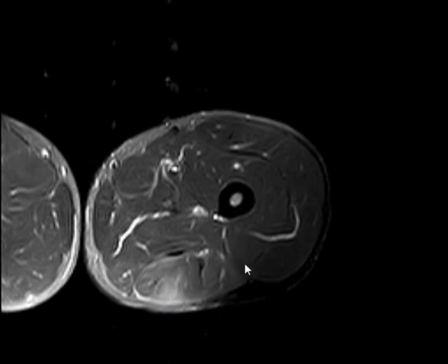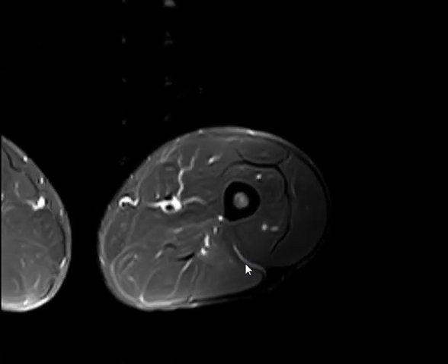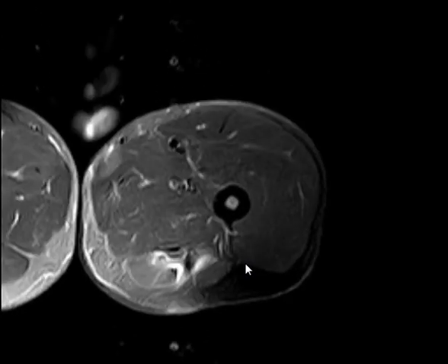So we are done: adductor longus, T2 hyperintensity. Look at the site, look at the anatomy of the muscle. Which site? Go up. So you can see this hypointense tendon of origin, right? This is the tendon, and this is the belly of the muscle. So this is the site of the musculo-tendinous junction.